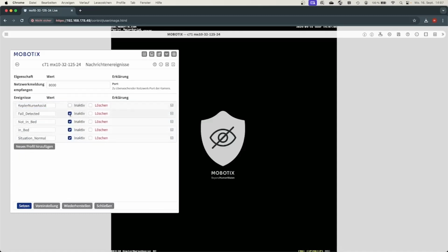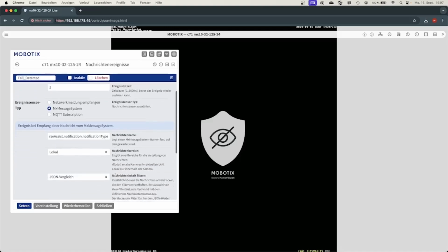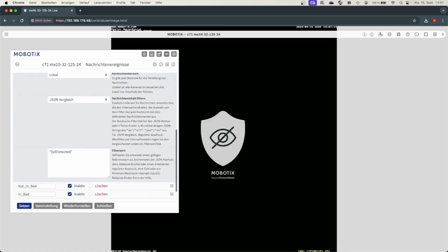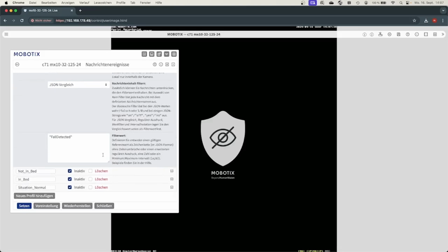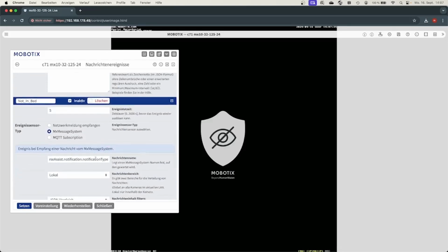If you want to define other events, say I only want to see the fall detected, or in addition to fall detected, then you can set it from inactive to active, and then you see in that profile for fall detected the notification messages and also the filter value are predefined. You don't need to change any of these settings. You only need to select inactive to active to enable that.